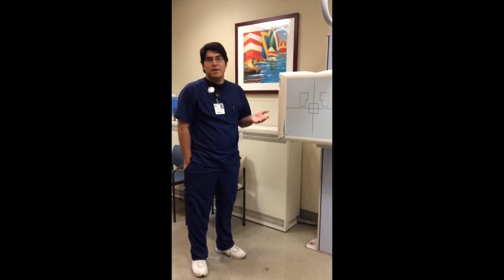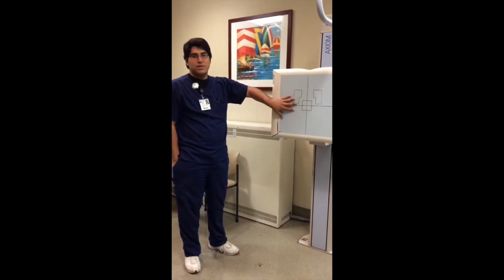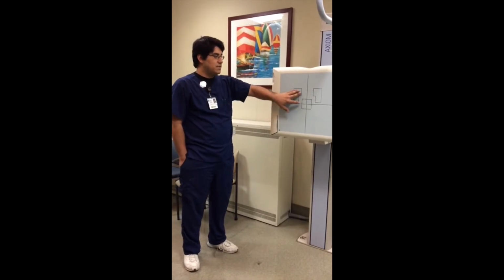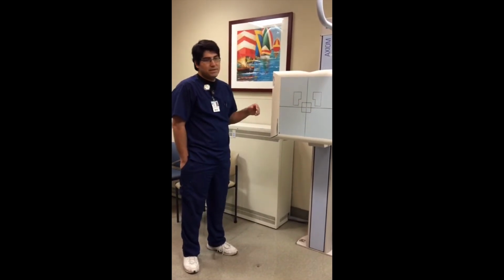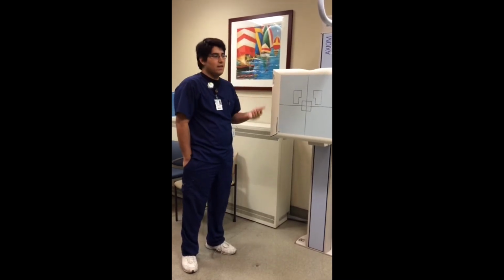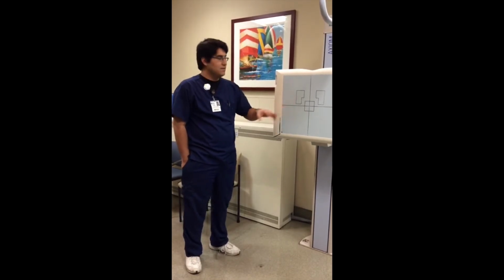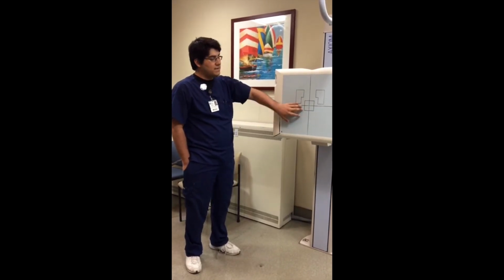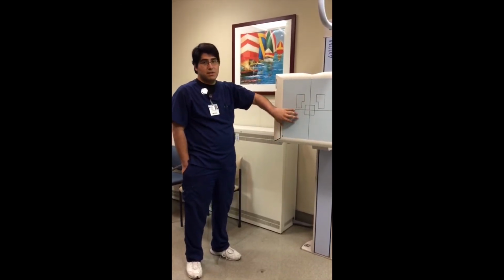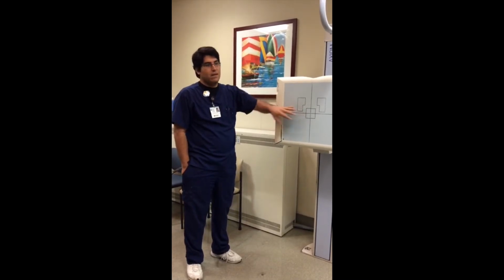So today we're going to be talking about AEC Chambers, which is basically right here in front of us. You can see that this is one of the setups that exists, which is a 3-chamber setup. And basically what AEC stands for is automatic exposure control. It can also be seen as AED, which is automatic exposure detectors, for obviously the detection here. And this comes in a setup of either 3, as it is here, some are 5 chambers, and some are 7 chambers.